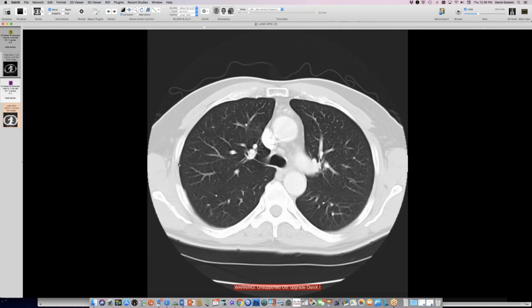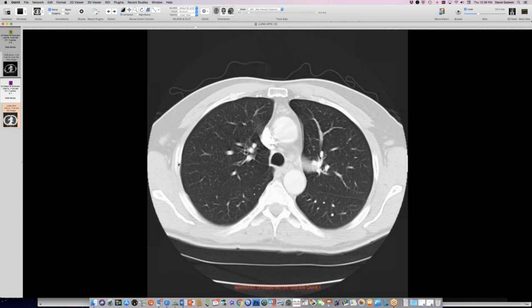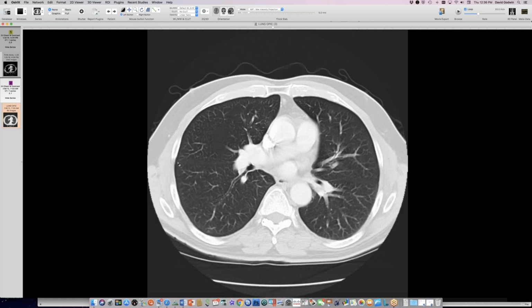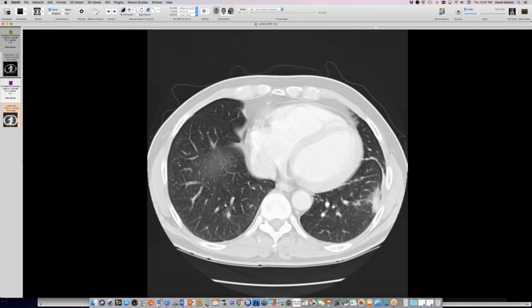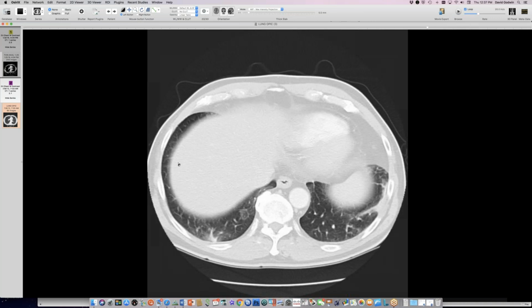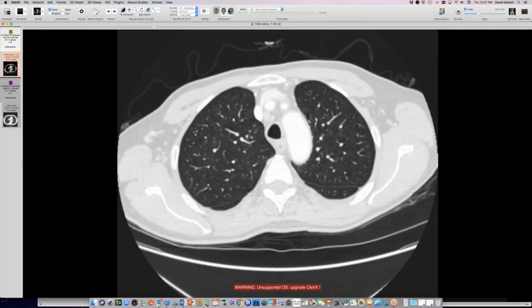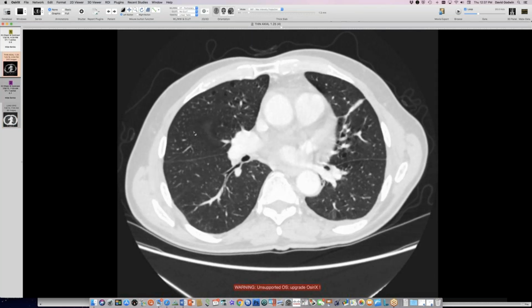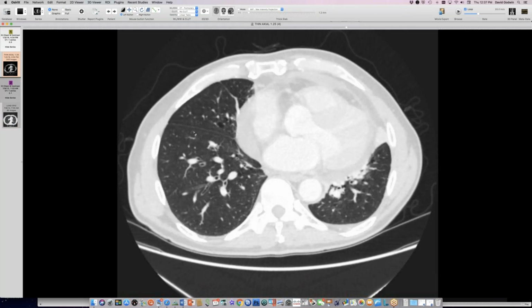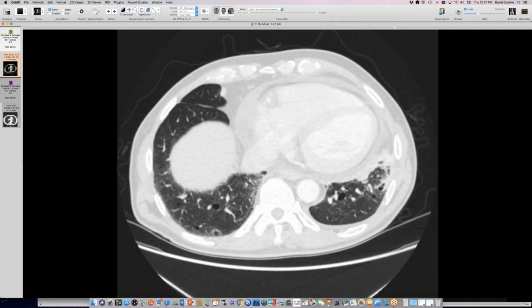Here's what his earliest CT scan that we have in our system looked like. This is back in 2012. And I think at this point he didn't have any lesions, or he had just a couple. And this is another autoimmune disease person that has some features of Sjogren's syndrome. So I brought up with our rheumatologist Howard's pointing out the importance of light chain deposition disease and the formation of cysts in the setting of Sjogren's disease. So he kind of liked that idea.